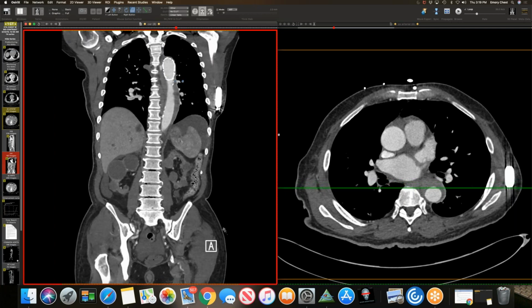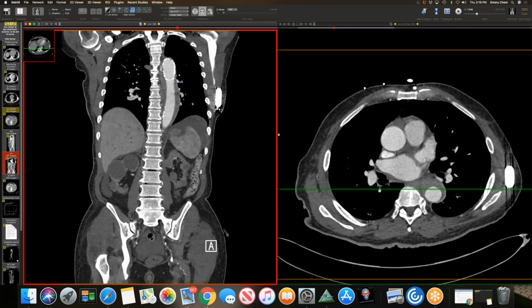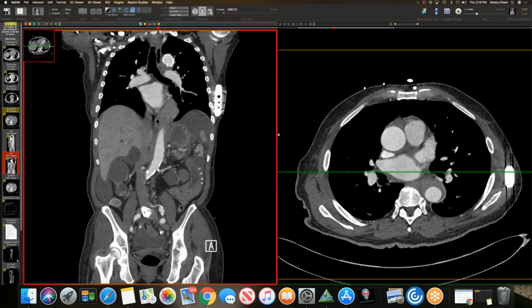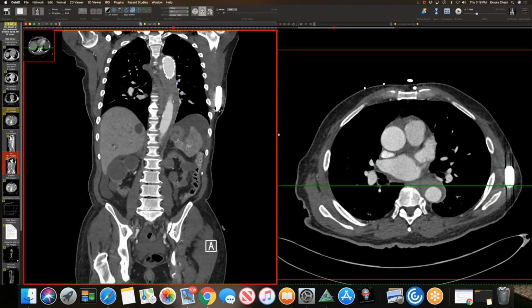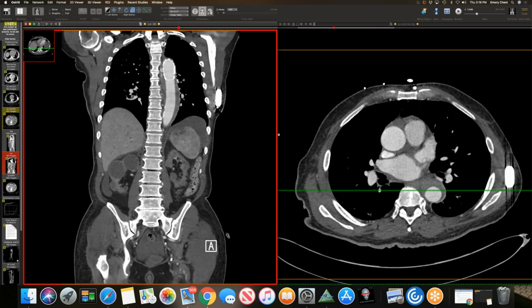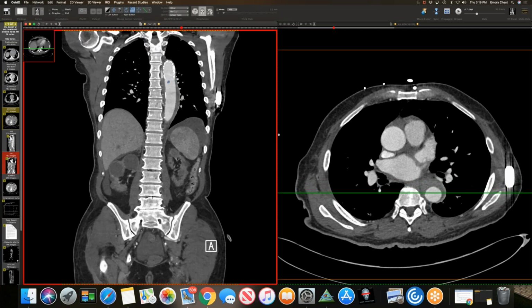And then they of course ordered a very short-term follow-up the following day of the same scan, and it was completely unchanged. And then another follow-up a month later was essentially unchanged. But I thought this was an interesting case because it highlights a concept that people who don't specialize in reading vascular studies can find confusing: it doesn't necessarily mean it's an endoleak just because there's contrast outside of a graft.